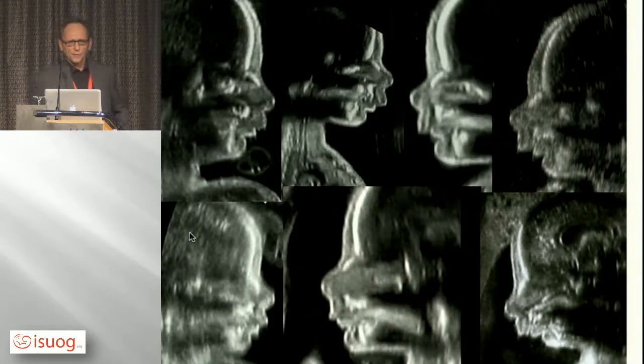Regarding the pathophysiology of isolated cleft palate, all fetuses with micro and/or retrognathia are suspicious to have such a malformation, but you can't trust in this alone. You see, these are all profiles from fetuses with isolated cleft palate, and you see very typical profiles with severe retro and micrognathia from children with Pierre Robin syndrome, but there are also quite normal profiles. You see here, you wouldn't expect a cleft. So another indicator suitable for prenatal diagnosis would be helpful.